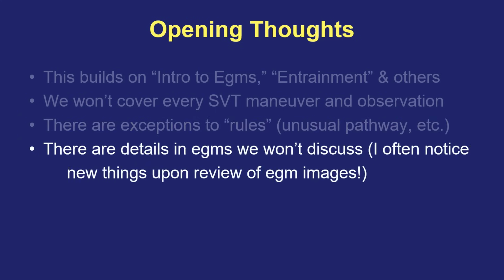There also will be details in the electrograms and the images that I'll show that I may not discuss. In fact, when I go back over electrograms myself, I often notice things in a subsequent review that I didn't see or notice the first time. If you notice something that I don't comment on that you think is relevant, certainly ask me in the comments or review these images with somebody who might be able to help you interpret something that I failed to explain.